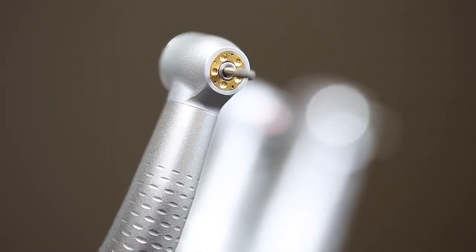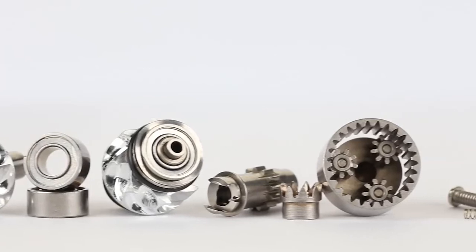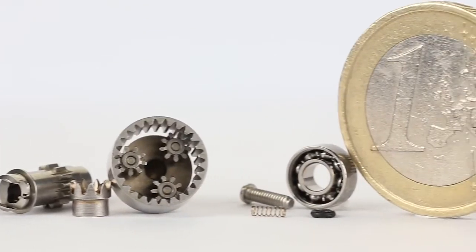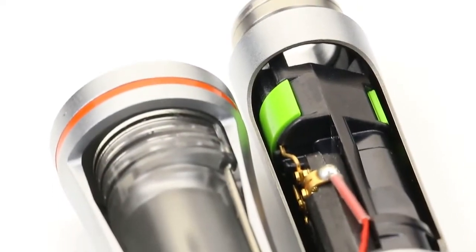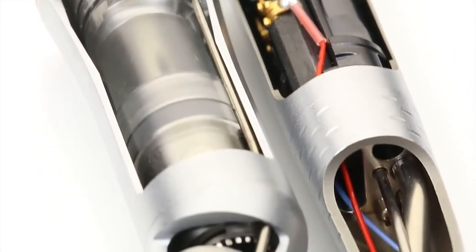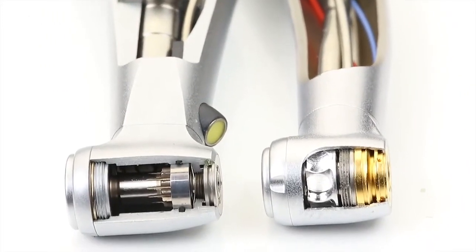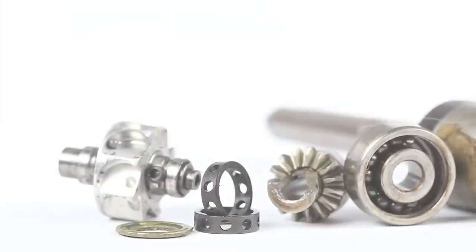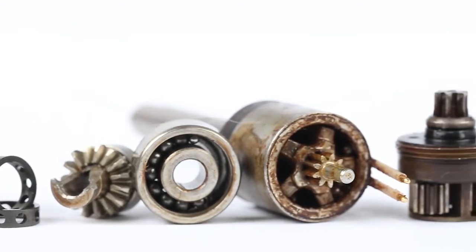Turbine handpieces and straight and contra-angle handpieces are precision instruments, which have to resist extreme pressures, not only during handling, but also through the hygiene and maintenance process required. Inside these instruments, there are high-precision ball bearings, gears, fiber optics and bulbs, electronics, air and water filters, and seals, which can only work properly if they are cleaned and maintained correctly and regularly. Insufficient lubrication also leads to faster wear of the rotating parts.